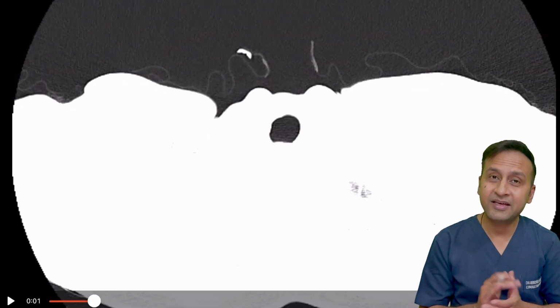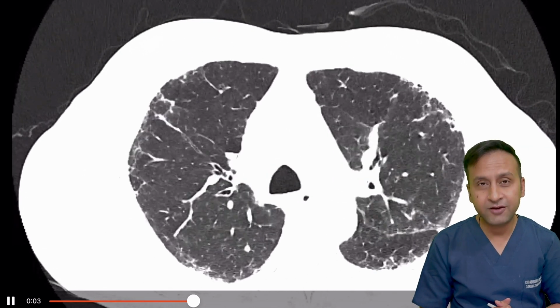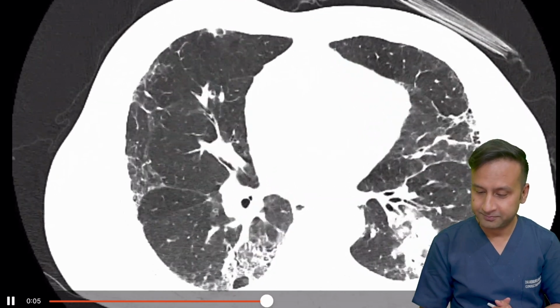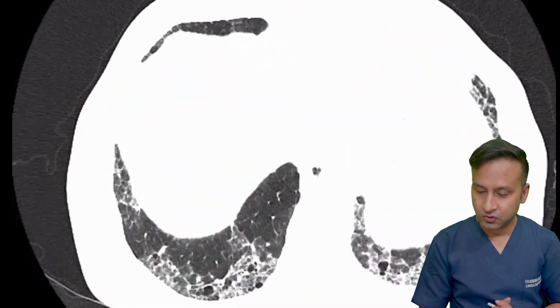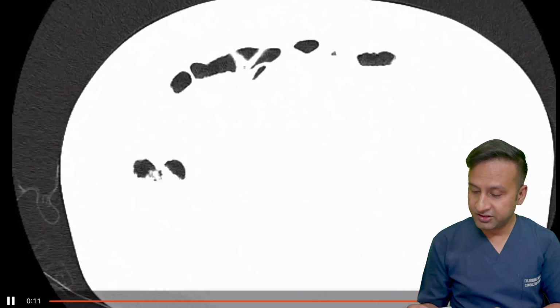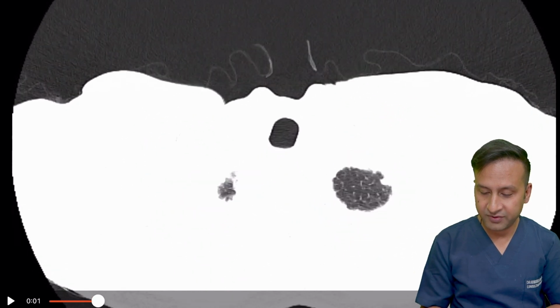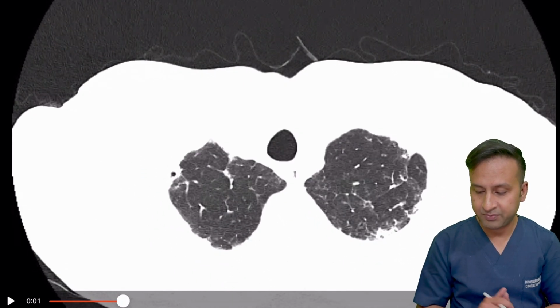So these are the cine images of the CT scan of the same patient. I want you to have a look at the CT images starting from top to bottom. So what did you see? What are the observations that you could make? Let me just reiterate the findings starting from the apex. So when I look at the apex, I can see something wrong. What is this something wrong?